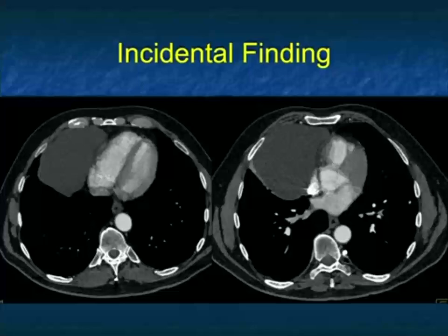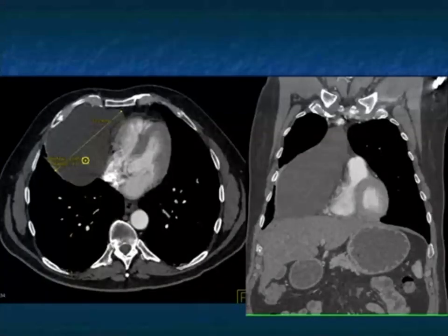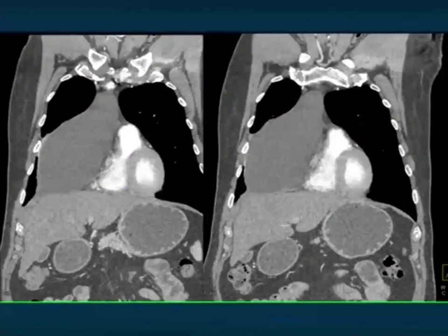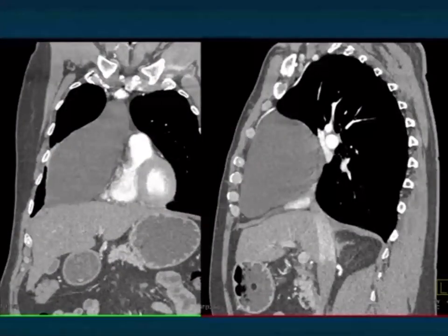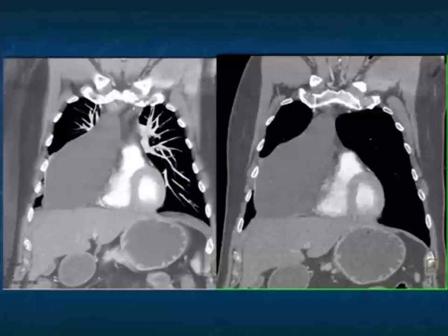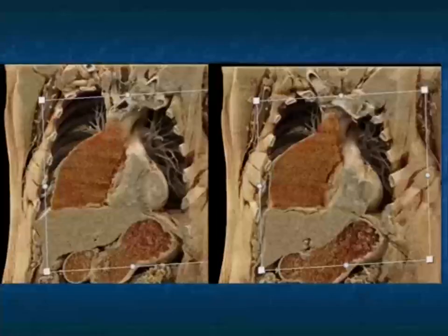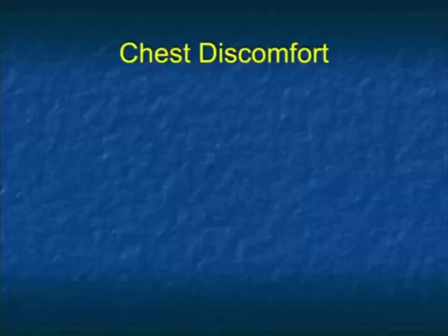Another lesion, cystic, eccentric, coming way up. When you first look at it, I would say pericardial cyst, but pericardial cysts don't typically come as high as this lesion is coming. Look at it on the coronal views. And so what are you dealing with? A great mimic of a pericardial cyst, and that's going to be a thymic cyst. Yes, thymic cysts are smaller typically. They're anterior mediastinum, but they can extend and hang downward. And this is an unusual appearance, nicely shown the fluid density on the cinematic, but a really great example of a thymic cyst. Really great case.